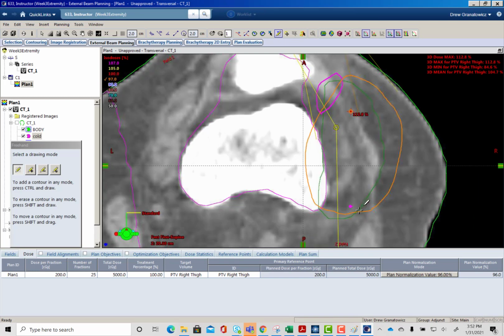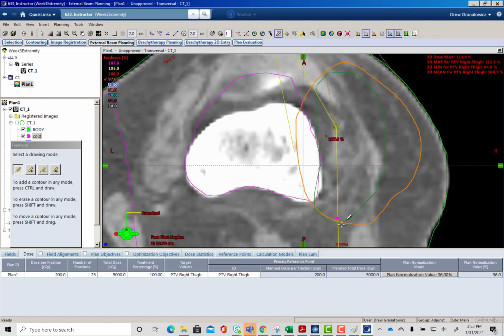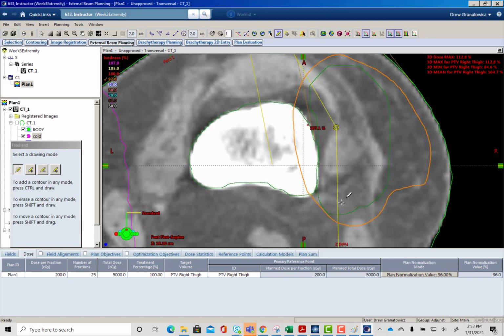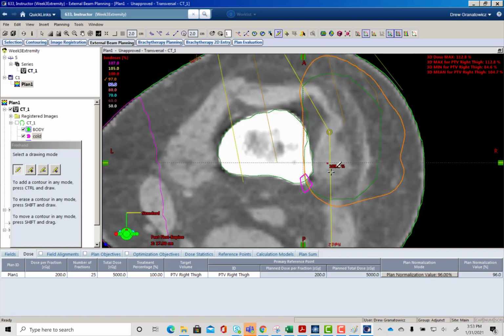But I'm slightly over contouring this area, which is okay. It's a small area. But if you over contour it like this, outside of your PTV, it'll just help you make sure you get that covered. But same thing, I would use this new contour in the optimizer in order to try to drive that min dose up. Missing a little here, so I would contour all that out.